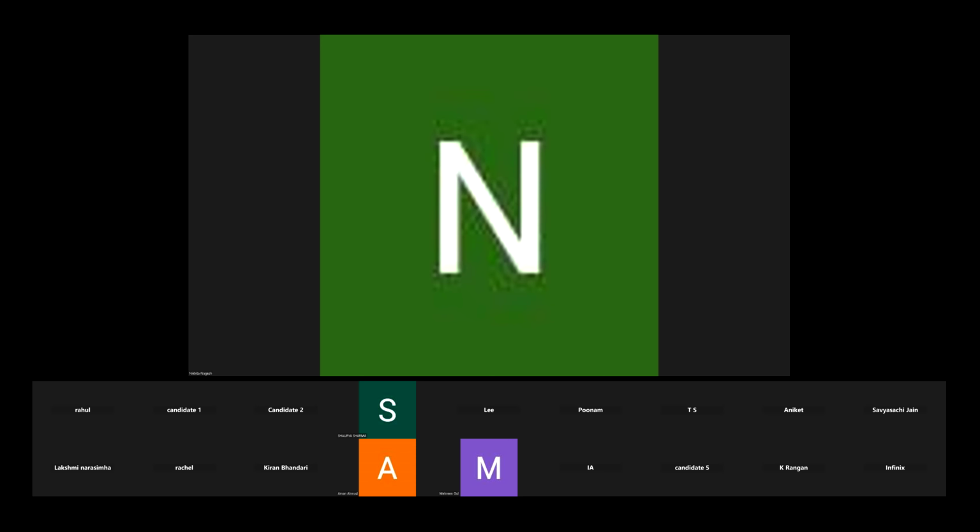Yeah, so ankylosing spondylitis and DISH, I think she covered the main points. DISH is more of flowing ossification, whereas in ankylosing spondylitis it is thin calcification along the annulus. And sometimes in DISH you see a thin lucency between the vertebral body and the ossification.